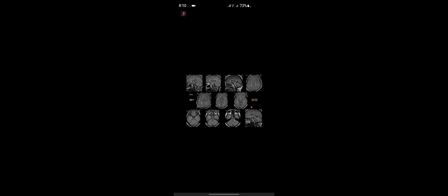I'd like to know, without previous imaging, we don't know if there's any new lesions, and we don't know if any of them are enhancing to further characterize if they're lesions of different time and space. But I think my primary diagnosis would be MS for this patient. And what is your differential?